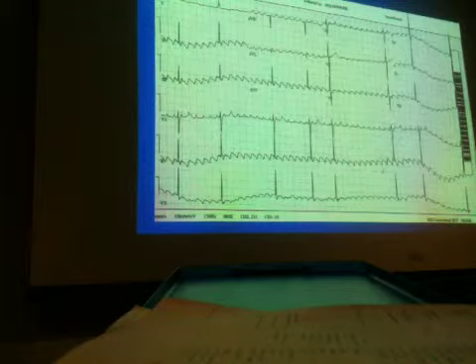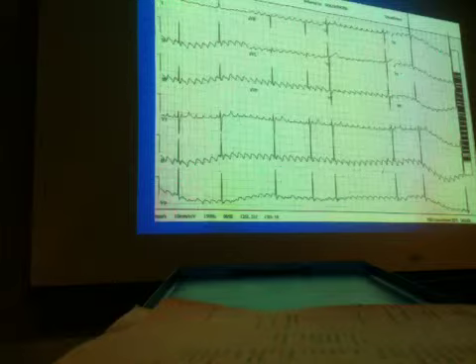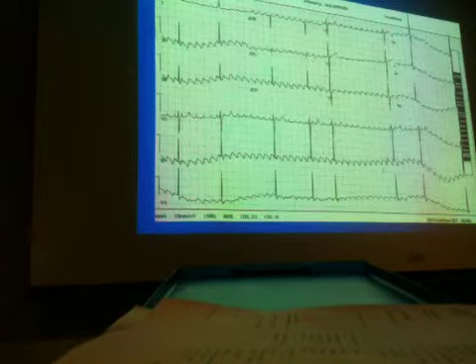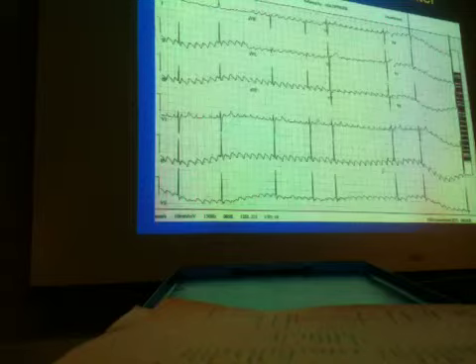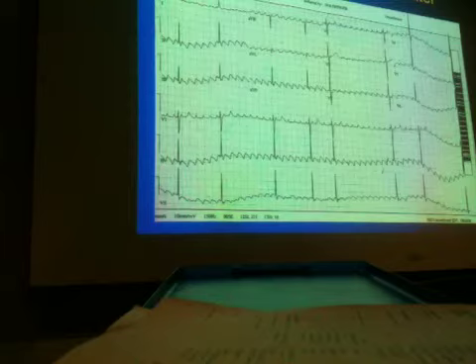What if I tell you there is a whole bunch of P waves? There's more than you can count. Actually, you can count them. Lots and lots of P waves, far more P waves than QRSs. This is a very textbook, classic picture of atrial flutter. See, that looks like a saw. See that edge? That's a classic pattern for atrial flutter.